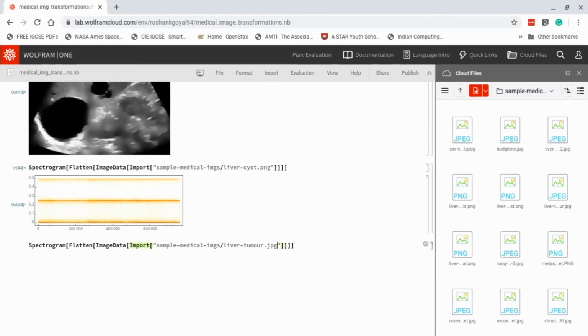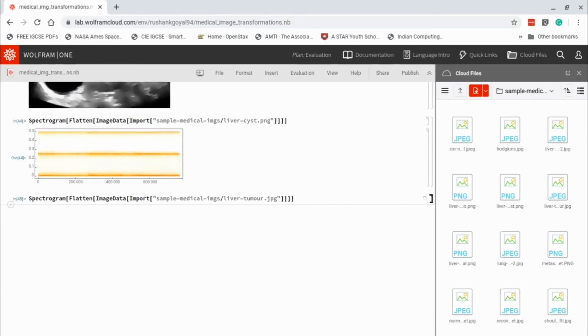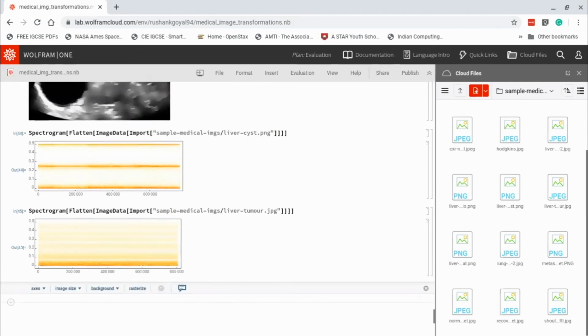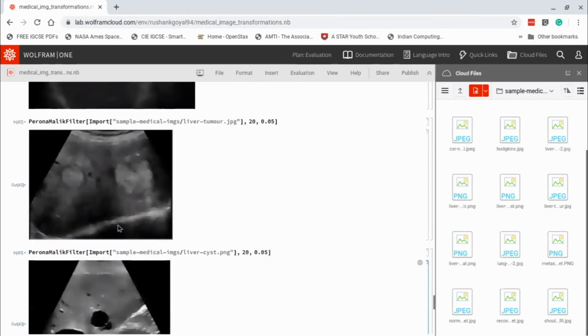okay, it's JPEG. I remember it by now. There's this one. So you can clearly see they're really different, although we didn't apply any meaningful transform, because this is not something you would usually go to as a first choice. But if you just keep experimenting, you can find out whatever differences these images might have. And these differences are mostly because of the colors of the images.